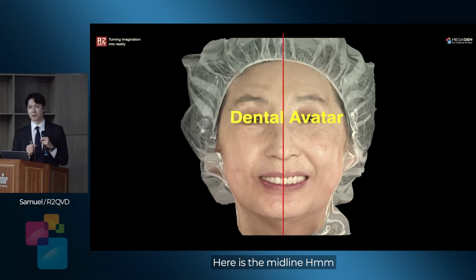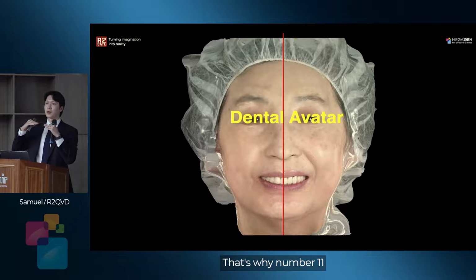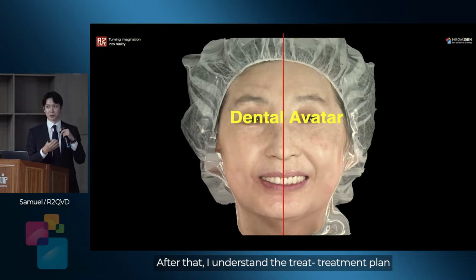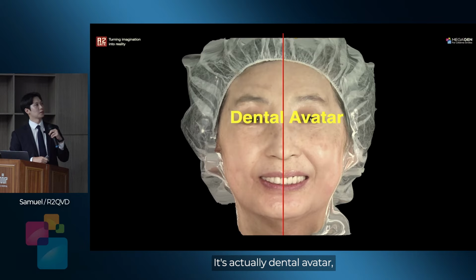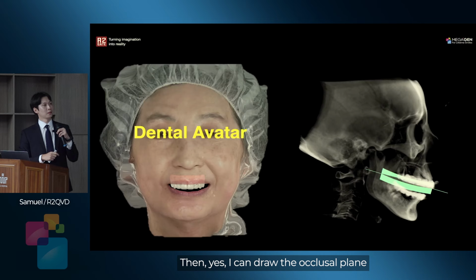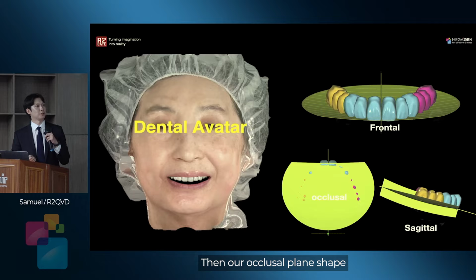Here is the midline. Then, yes, the anterior teeth will be tilted. That's why number 11 is 2 millimeter longer, number 21, 3 millimeter longer. I got it. After that, I understood the treatment plan, which means I can design very easily. And what I design is actually the dental avatar. Inside the facial scan, I already merged the CBCT data. Then I can draw the occlusal plane based on the FH plane. Then our occlusal plane shape is like this.